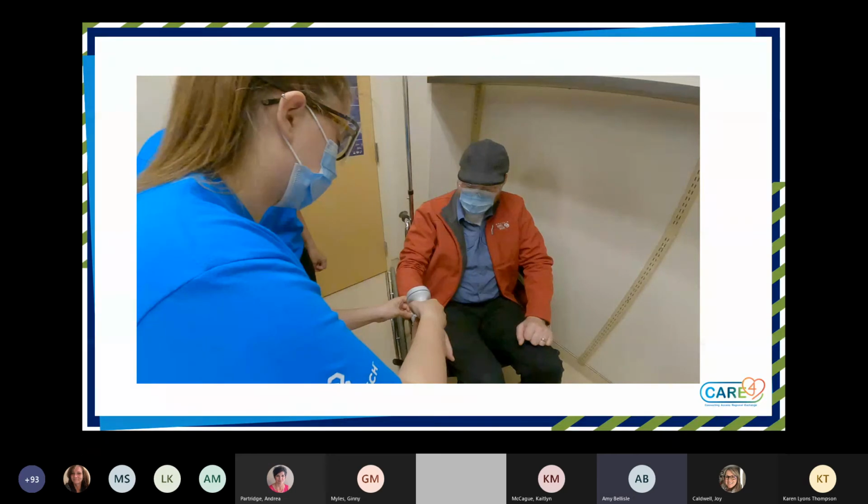Okay, so TAR, transfusion administration record. What is this? For 3 of the sites, we currently use TAR. This is net new for RVH, and we're very excited to be able to bring them on board and be able to electronically scan and document transfusions.